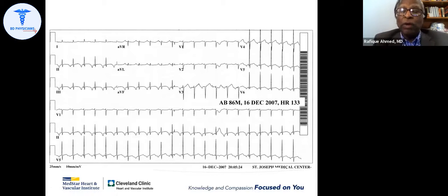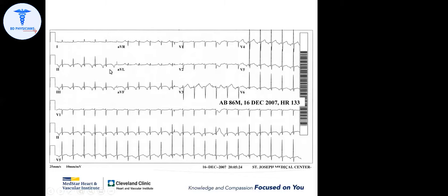Thank you. What we are actually trying to do with this is instill in you a process of thinking. Remember that nobody will be able to give the exactly correct answer if challenged unless we can see the waves. But the whole point is being able to analyze. Like if this P wave was upright, we would have thought differently.